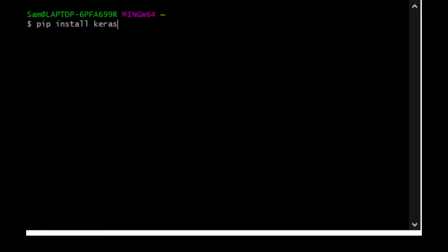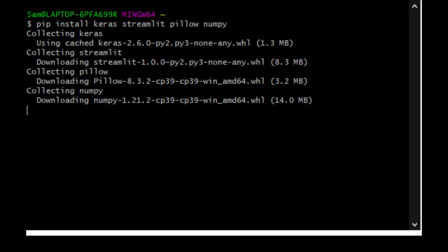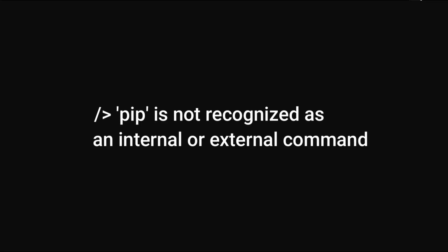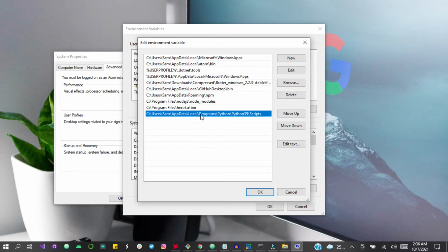To get your environment ready, install the relevant packages by running this command on your command line. Pip is automatically installed when you install Python on your computer. In case you come across the "pip is not recognized as an internal or external command" error, make sure you add Python to your environment variables. With the 4 packages, you are ready to start a simple image classifier.